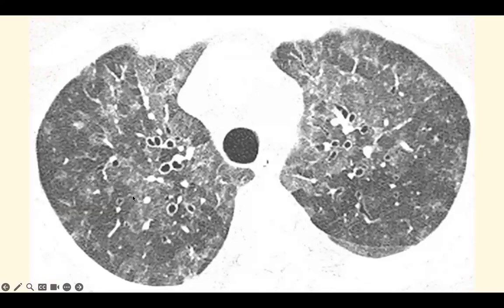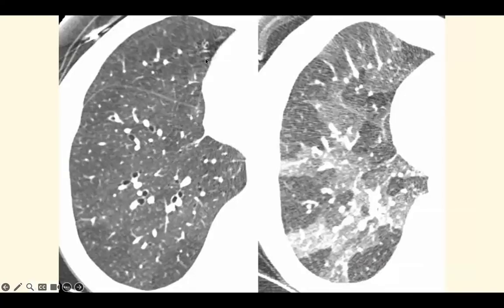Here, the other feature, which is ground glass opacities, diffuse or patchy. Then the mosaic attenuation, where you see heterogeneous lung and homogeneous lung. The pathology here is the low attenuation regions, which are subtle here with lobular appearance. In expiration, it will accentuate the difference between the normal lung, which will be whiter, and the black areas will keep their density low, and the difference will increase between the normal lung and the diseased air-trapped lung.